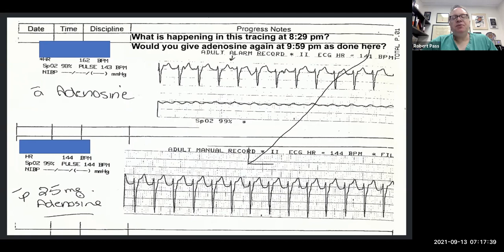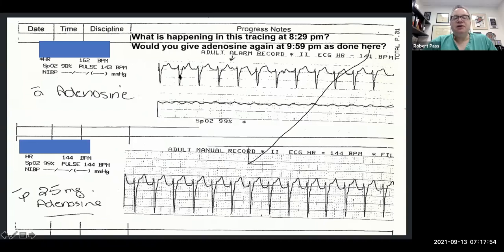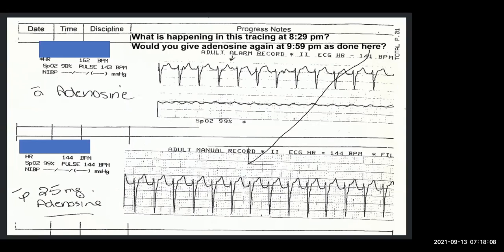You've made an observation that the P wave seems to be changing in regards to its relationship to the QRS. You noticed this P wave between the QRS and the T wave, which I agree, and then that this P wave near this arrow was in a different location in relationship to the QRS. Do you still stand by that comment? I do.